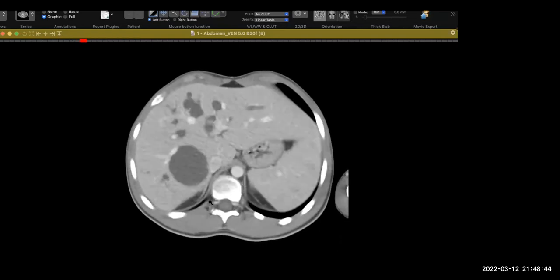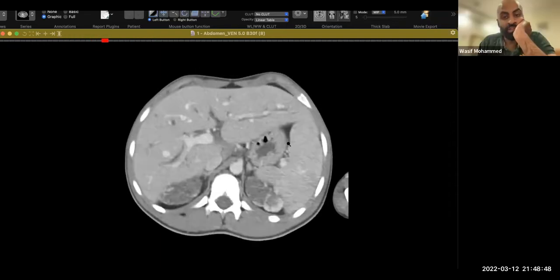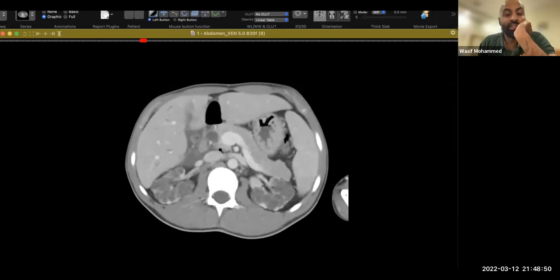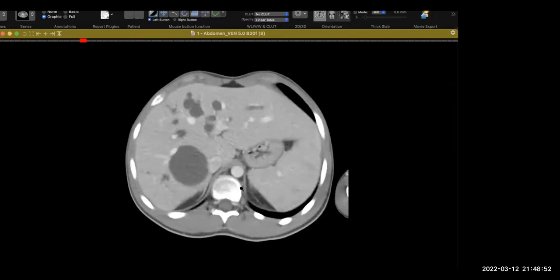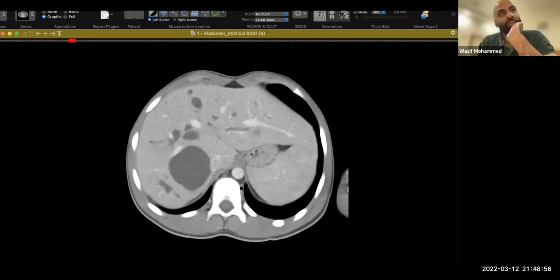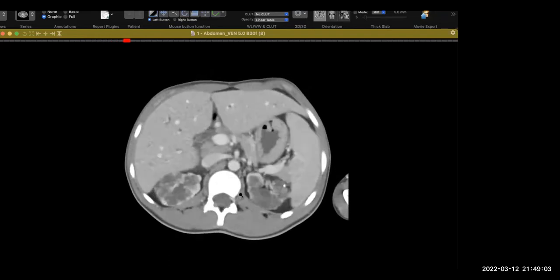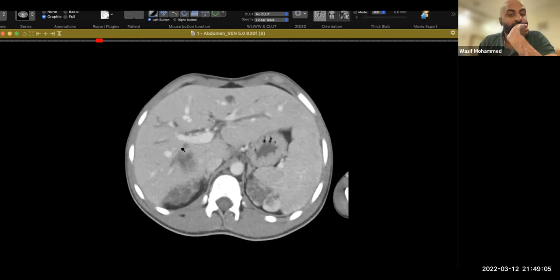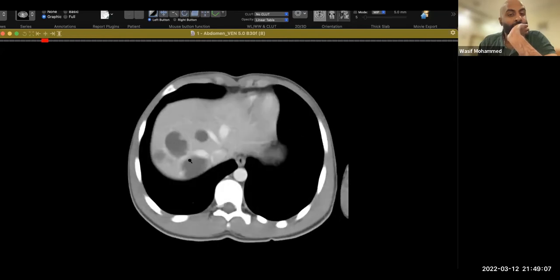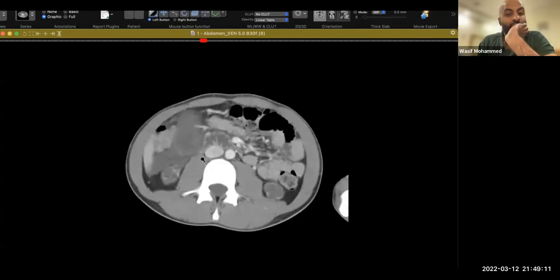Okay, so we are not seeing any fibrotic changes per se in the liver, but there is liver enlargement, there's splenic enlargement, the portal vein is dilated. Okay, so Caroli's disease is associated with medullary sponge kidney, no doubt, but it is also associated with autosomal recessive polycystic kidney disease. Yes. So this is Caroli's disease. And the patient has a transplant kidney, which is incidental. We don't have anything to do with it.